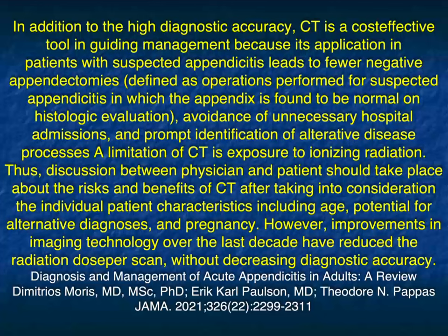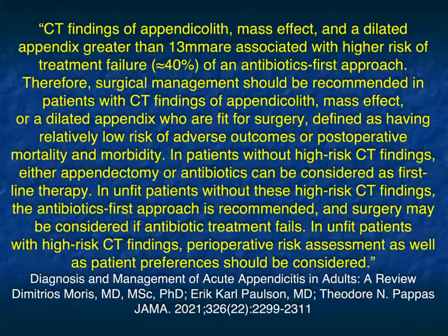It's also useful in pregnant patients. The more frequently now people are doing MR to help decrease the radiation burden. CT findings of appendicitis, such as appendolith, mass effect, and a dilated appendix over 13 millimeters, are associated with a higher risk of treatment failure of an antibiotic-first approach.